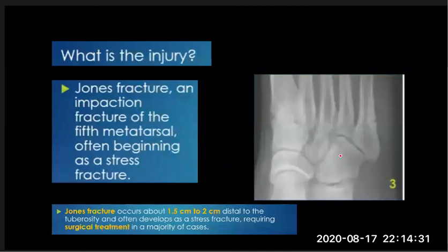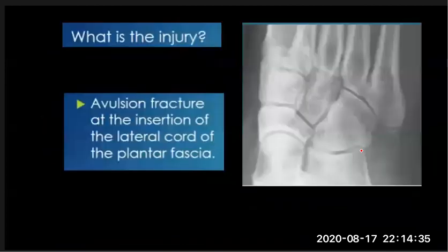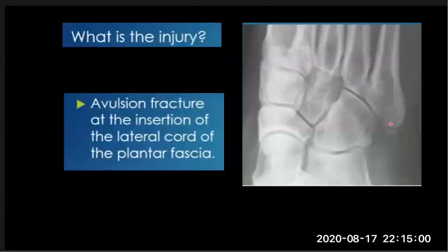Okay, so let me repeat, because these are important. This is no injury, a normal apophysis, vertically oriented. Here, transverse, is an avulsion fracture. The small one is due to plantar fascia avulsion.